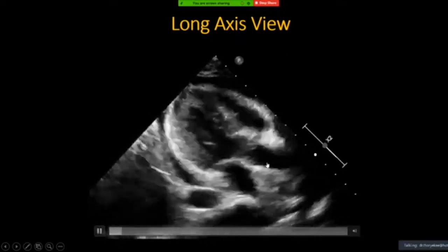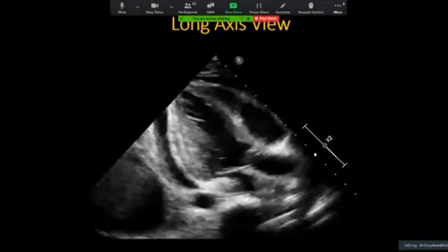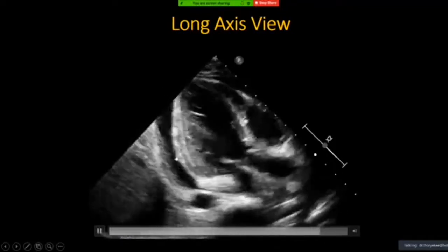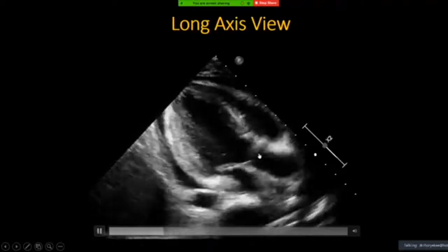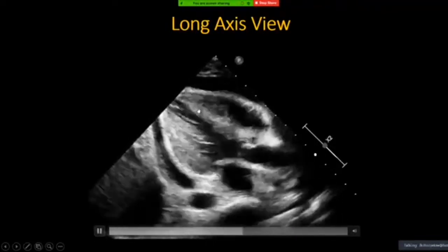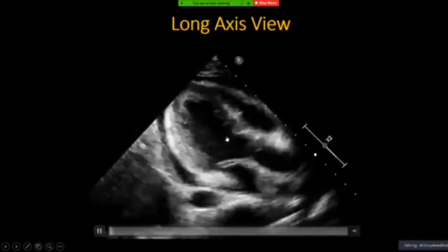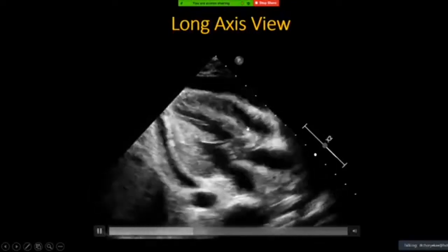And sometimes, depending on how you analyze the echocardiogram, you can go from out to in or in to out, right? When you look at it, very marked is the significant pericardial effusion, but don't forget what is inside the heart. A lot of the time I like to start from the chamber itself. When you look at the left ventricular chamber, right ventricular chamber, and the atrium, there seems to be a relatively slightly smaller volume compared to the normal one.